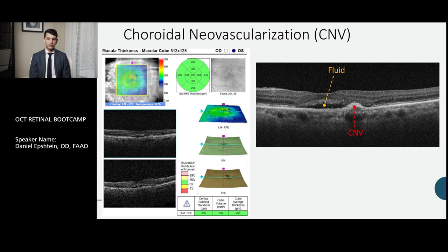And this is important to make sure, one, that you know exactly what you're looking at, so you know to send this over for treatment. But two, you can also co-manage this with the ophthalmologist to see if anything is improving, worsening, or staying the same. And that can sometimes be important when you have to send the patient back.